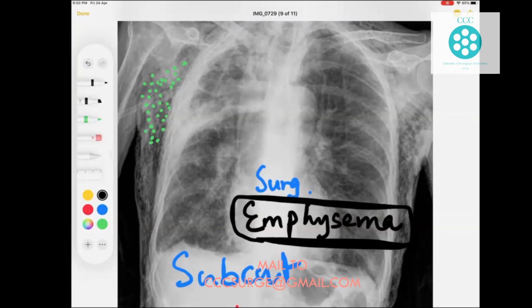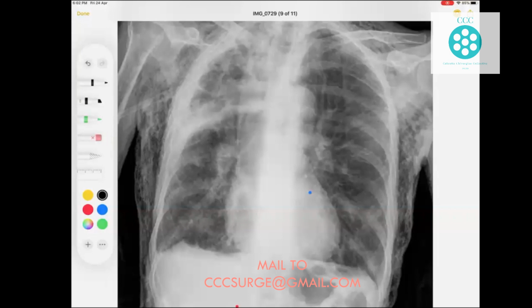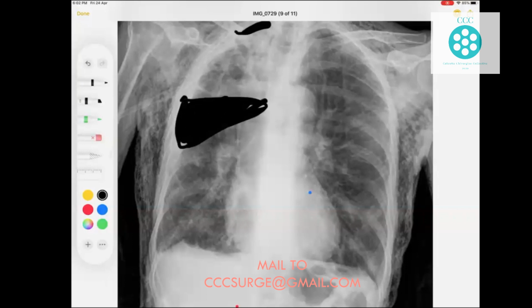In the surgical emphysema, as you can see in this picture, there are multiple air pockets in this whole tissue. So if you combine the clavicle fracture with this shadow, I do not know what this shadow is. Maybe it is a little bit of lung that has undergone a collapse. Maybe there is a little bit of liquid in this.